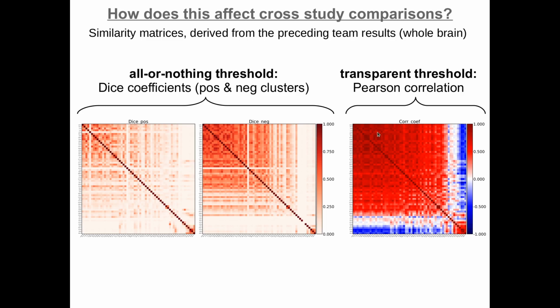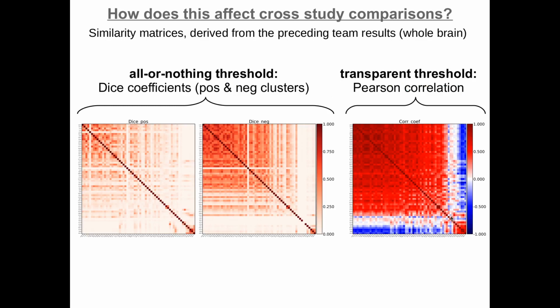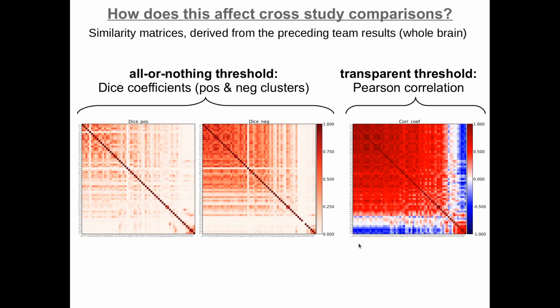So this bulk of subjects is nothing more than most of the rows here of subjects, and then that small square at the bottom was these few subjects here that are kind of anti-correlated to these, and those would probably be sorted out. And it is true, there are a few subjects, maybe 3 or 4 teams' results, that are just different to everything. And I think that's pretty reasonable to expect in a study. For example, this group only has positive results, so they're just reporting something different, and maybe there were different modeling or processing choices in some of these as well. I'm not surprised by that.